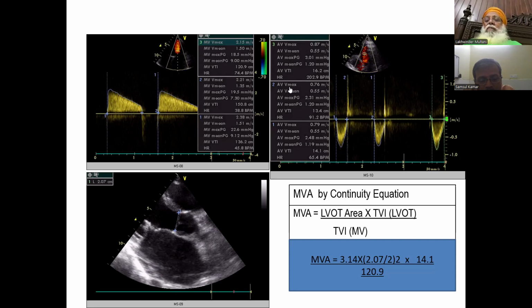It means they have what kind of valve? Single leaflet, double leaflet, or a ball and cage? Double leaflets they were. Perfect. If you happen to see the leaflets are not opening up, just look at one important factor, which is their mean gradient across those particular valves. We don't look at an area. We look at the mean gradient across that valve.